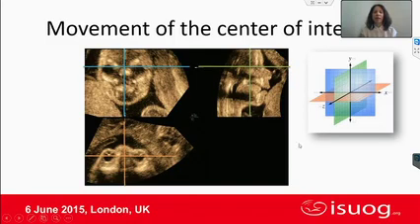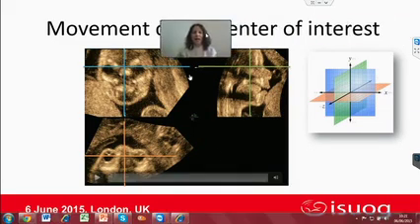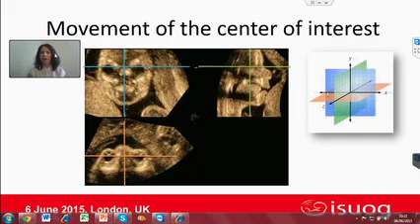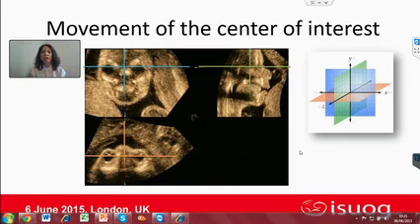Now look at the C plane. This is the C plane, the A, B, and C. The C plane has the same x-axis as the A plane. Okay, look here. They share the same x-axis, and it has the z-axis. Here, this is the z-axis of the A plane. Now we can see the clip.